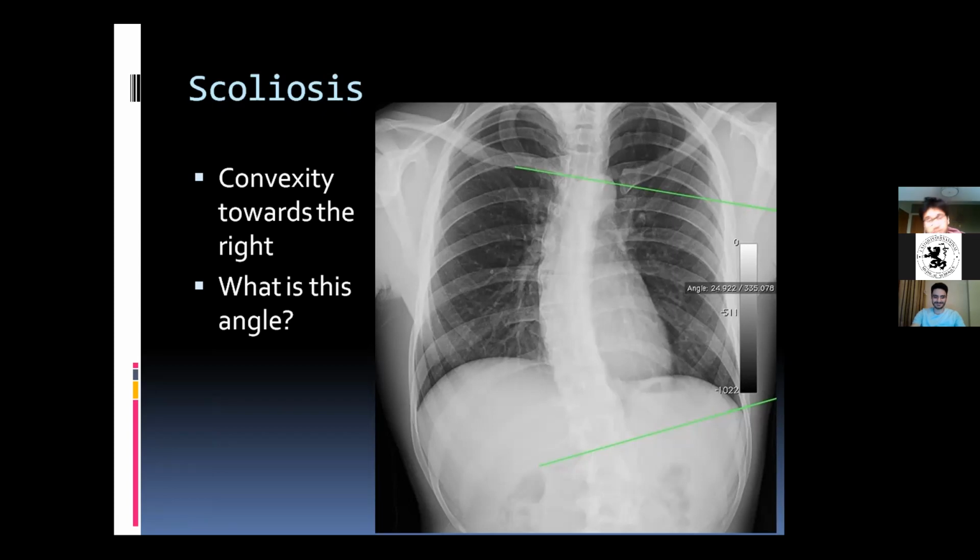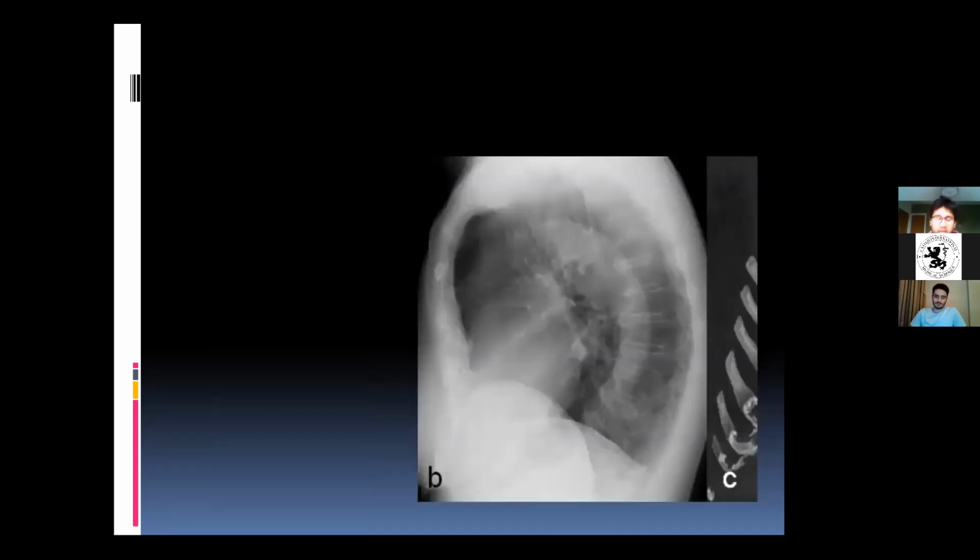You're right, you would definitely call ortho. You definitely have to do an orthopedics referral, but in the UK anyway, the angle should be more than 30 in order for them to even consider surgical intervention. Until then, we only manage conservatively. I know it's really bad when it comes to that, but as you can imagine, the pressures that ortho is on are quite a lot. Okay. Right. Moving on, what do we see here?